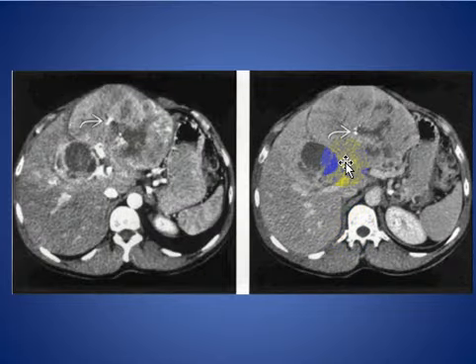Another patient has a large heterogeneously enhancing mass with necrosis and calcification and washout in the portovenous phase.